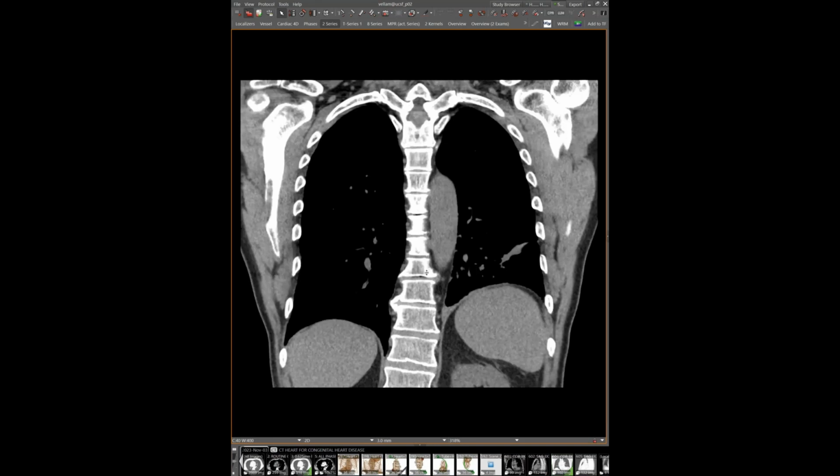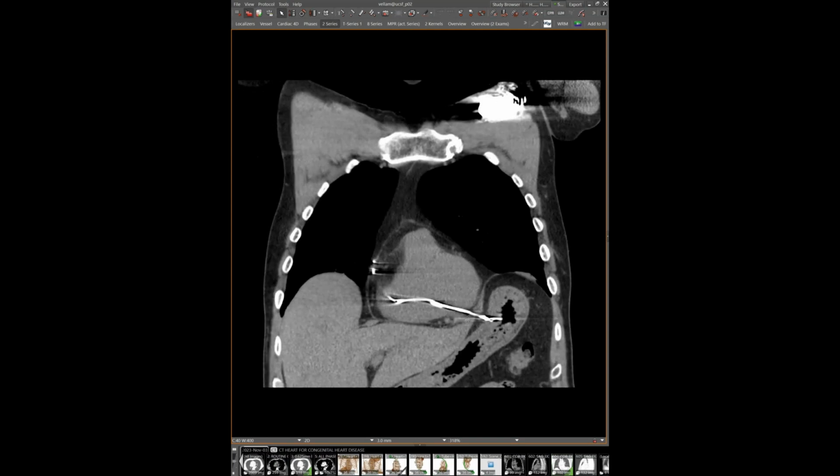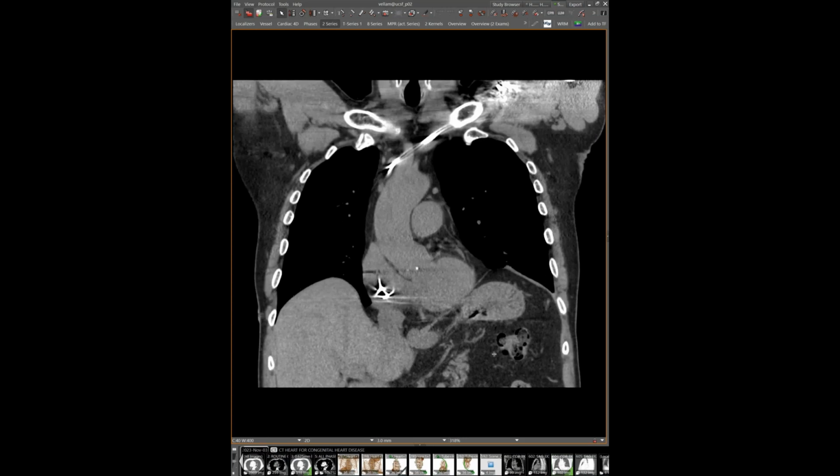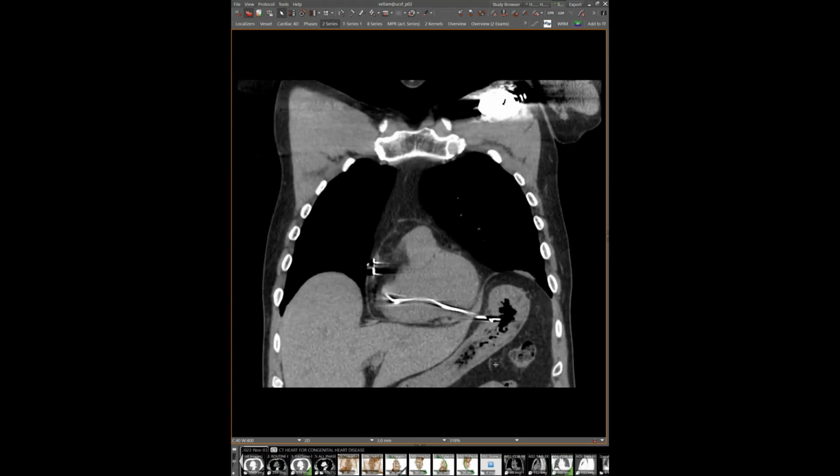Yes, agreed. But if you look at the coronal CT on that pacemaker perforation case, you see the left hemidiaphragm is really high. So in a way, the stomach has come up to meet alongside the heart, and I think that's why you got this striking course here. It's because the diaphragm and the stomach are in the wrong place. So perforation here has different consequences from what it would have if the diaphragm were lower and the stomach were out of range. It would have just gone into the lung at that point.